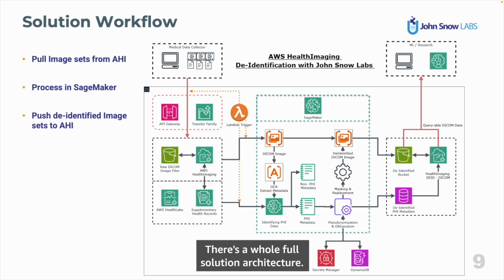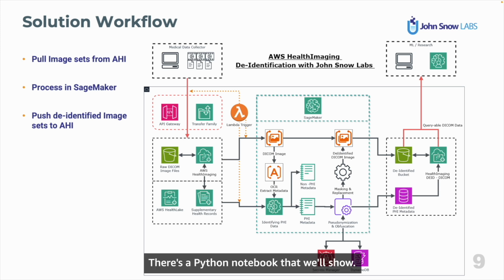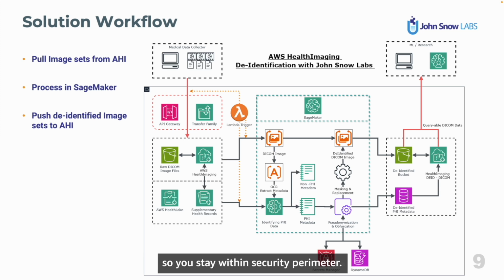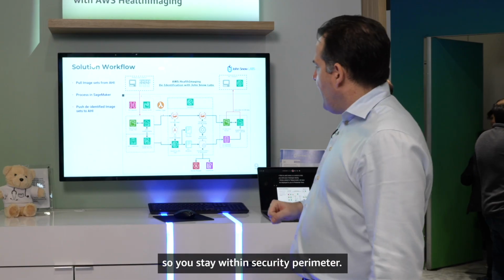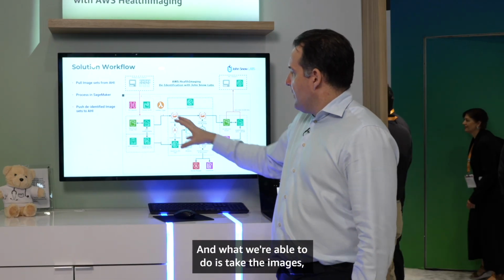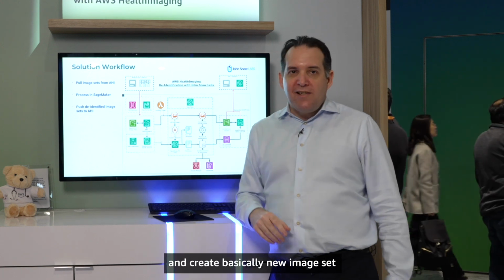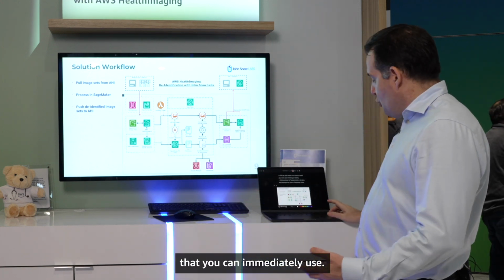There's a whole full solution architecture. There's a Python notebook that will show the whole solution runs within your environment. Your data is not shared, does not ever go anywhere, so you stay within the security perimeter. And what we're able to do is take the images, run through any de-identification that you want to configure, and create basically a new image set that you can immediately use.